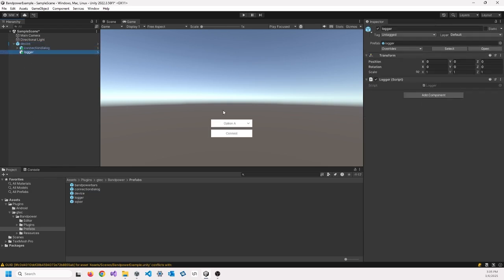I want to add a signal quality bar to visualize signal quality of all acquired channels. Drag the SQ bar prefab to the scene and drop it onto the device prefab. I want to add a bandpower plot to visualize bandpower. Drag the bandpower bars prefab to the scene and drop it onto the device prefab. Click the play button.